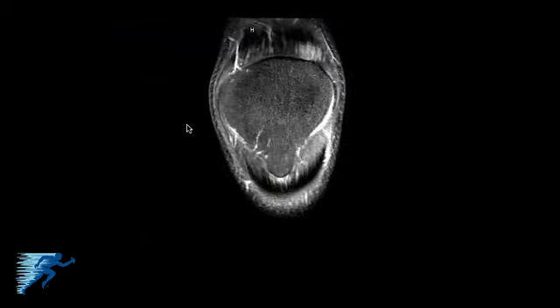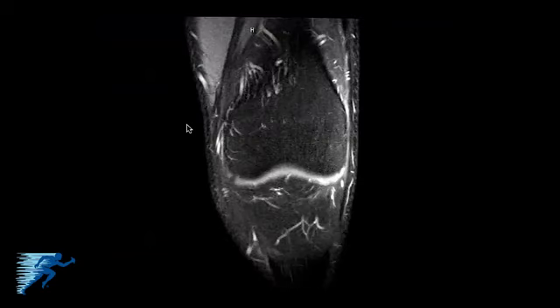So when we first start out looking at a coronal scan, we can see the kneecap or the patella, and it's located at the central location. As we go deeper, you can start to see the quadriceps tendon and the patellar tendon below it. And then as we go even deeper, we'll start to get into the tibiofemoral joint. On the MRI scan, we'll start to see initially the menisci come into view. So here's the medial meniscus in its front aspect and the lateral meniscus. And then we'll start to see the iliotibial band on the side.